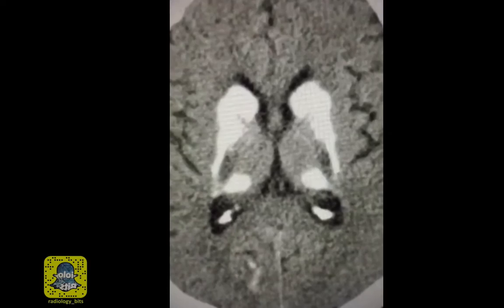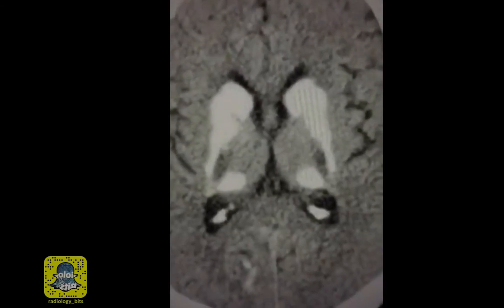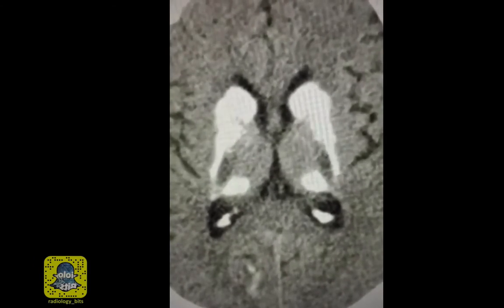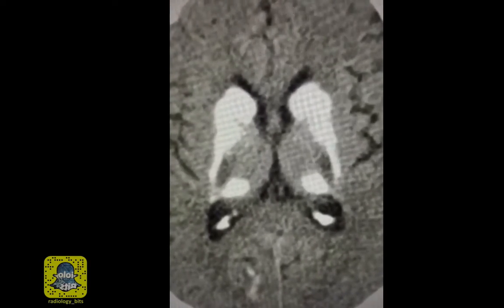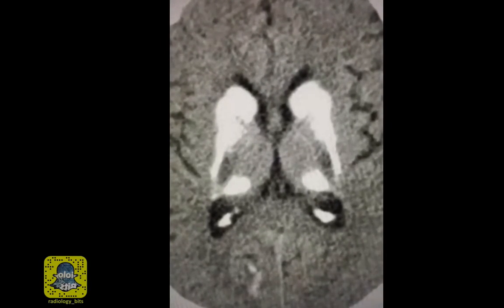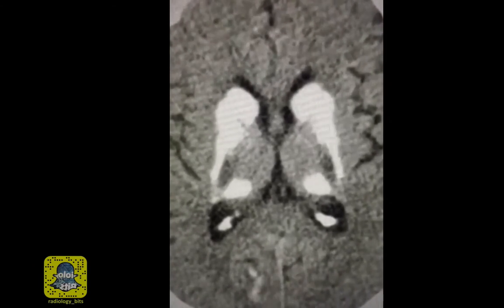The differential diagnosis starts by knowing where normal calcifications may occur, especially with aging, and normal calcifications could happen in a faint way within the basal ganglia, pineal gland, habenula, dura, falx, tentorium, superior sagittal sinus, dentate nuclei, or vessels. And whenever you see extensive calcifications in a younger patient, try to think about a differential diagnosis, since calcifications are more likely to occur in older patients, patients who are older than 50 years old.